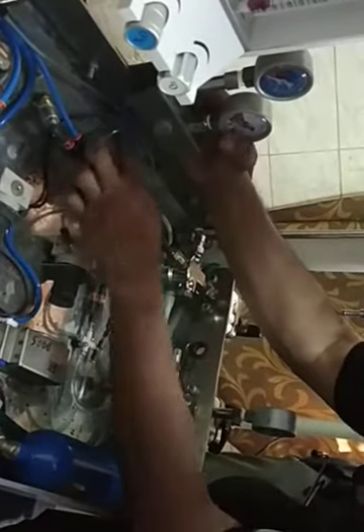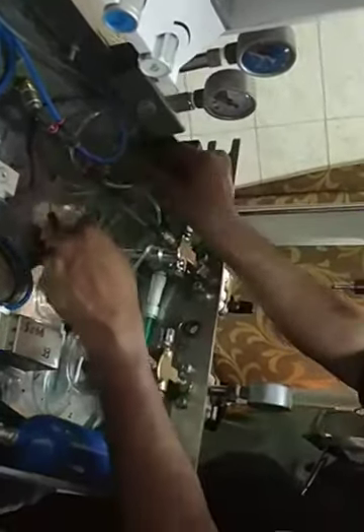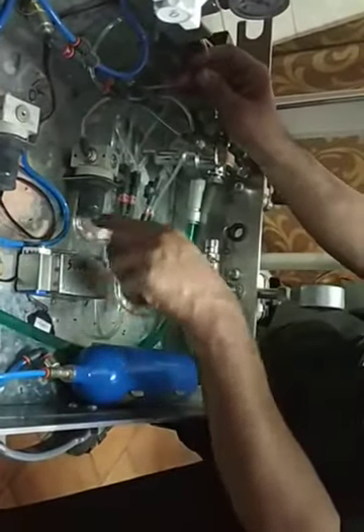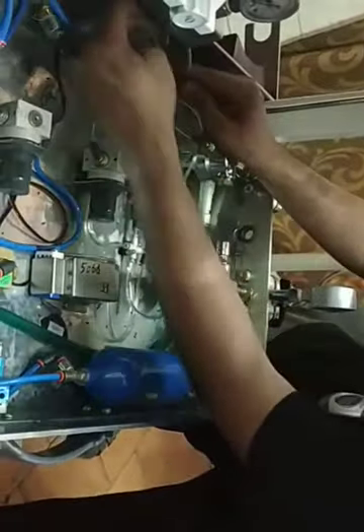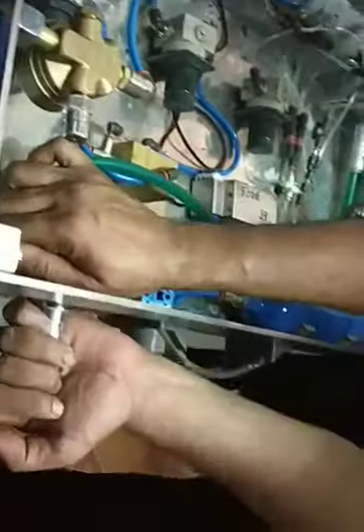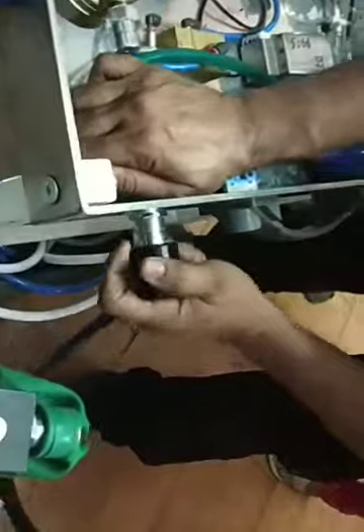And then this is from here, here, and there is one. So this is also connected over here, and this from here goes to the flow meter. From here it goes to the precision vaporizer. From here, this is going to the screw pipe over here. This pipe is going here, and this is my inlet. This is where I can select a circle system or open system, and from here it goes to the patient.